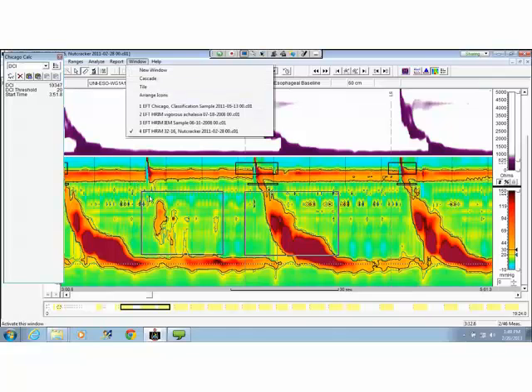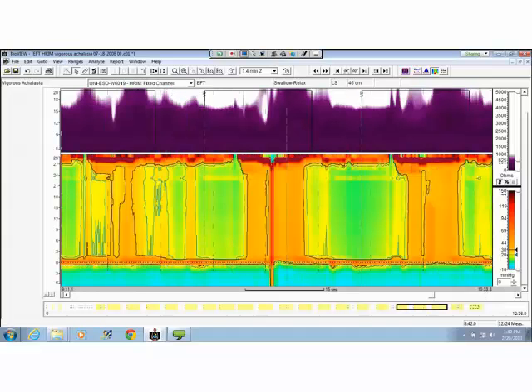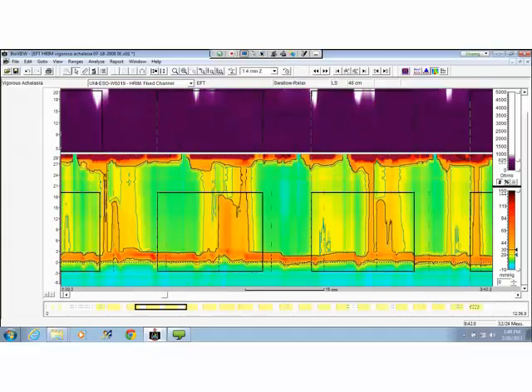Right. That's a good question. I might be able to show that on the achalasia study. This one has a lot of delayed pressurization. They're not contraction waves, but they're pressurizations. So in this, let's see. Let me see if I can find a good single swallow.